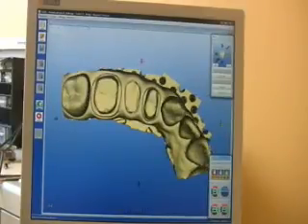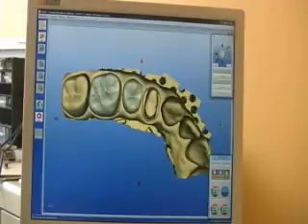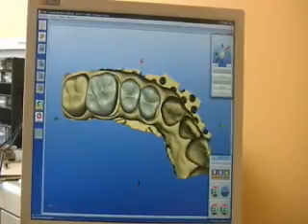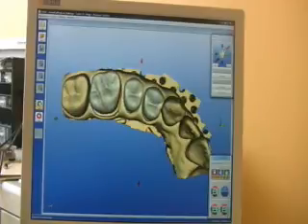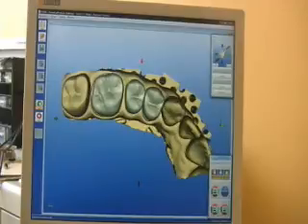We're going to hit the green arrow, and you will see how with 3.8 it's going to lay down all the proposals at one time and then manipulate them individually. This is different than in 3.6 where we designed, modified, moved to the next proposal until we were complete with the whole restoration.